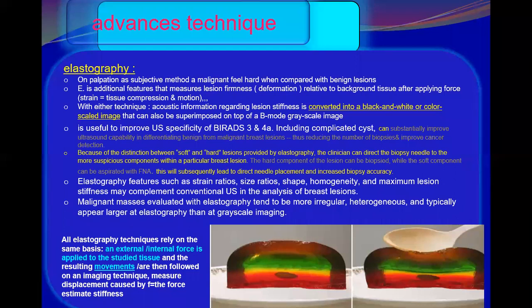You don't want to do interventions for benign lesions, and at the same time you want to maintain or enhance cancer detection. So for equivocal lesions, we need to use elastography to help us either upgrade or downgrade lesions.